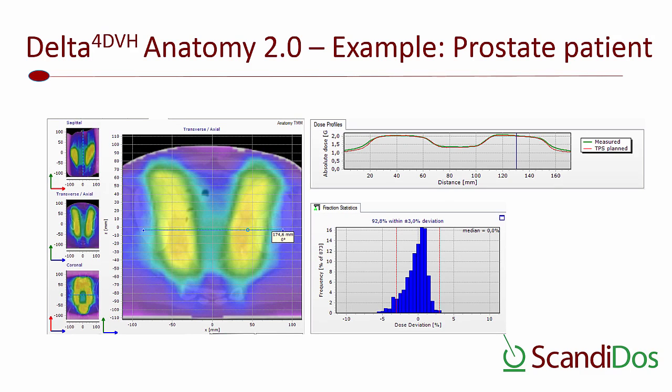If we go on to the Anatomy view of this, also looking at a horizontal profile, same as for the measurements, in the calculation here, we can see the good agreement, which is also verified here in the histogram, where we have a 0% median dose deviation.